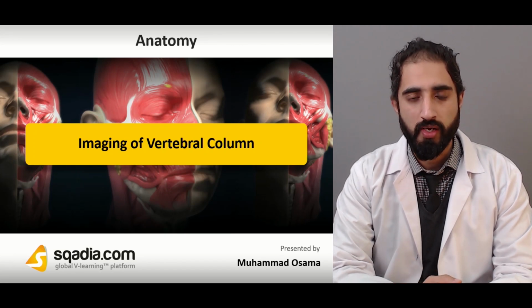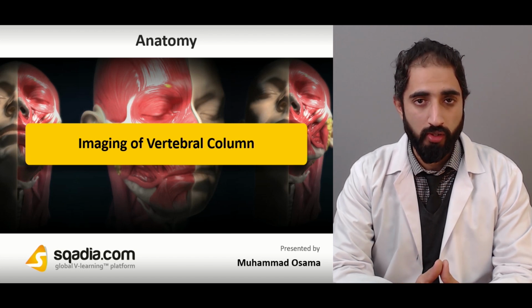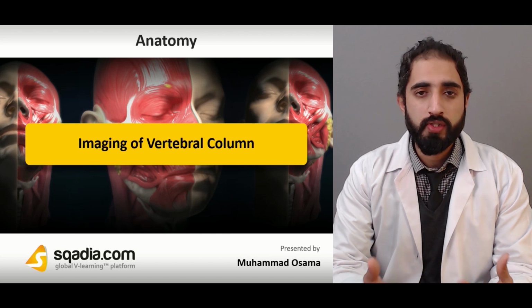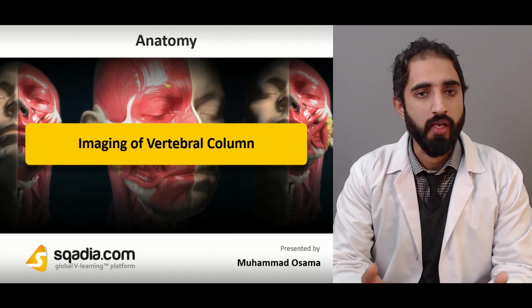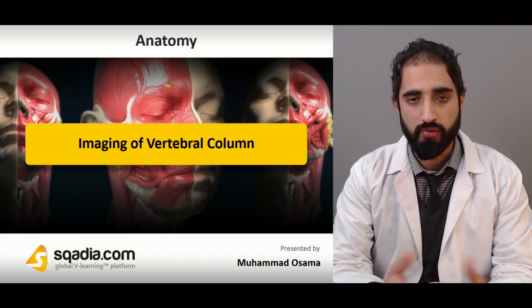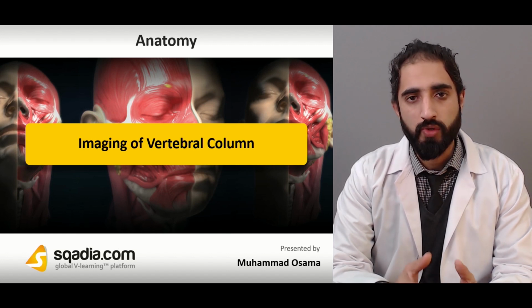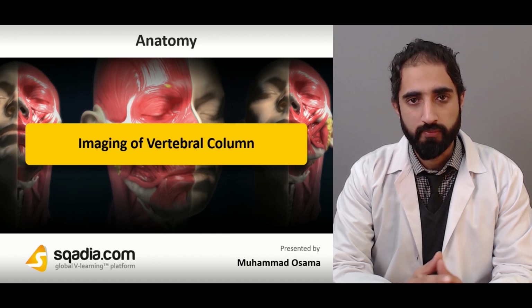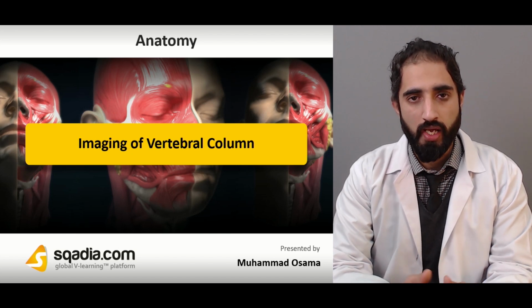My name is Mohammad Osama, and today we are going to talk about imaging of the vertebral column in terms of anatomy. First of all, we need to know the different anatomical structures whenever we talk about any region, and the spine is one of the most important regions whenever we talk about musculoskeletal anatomy or different neurological problems concerning the spinal cord. And once we know the anatomical features and landmarks, in clinical practice we need to identify those structures on radiographs and imaging as well, such as MRI and CT.